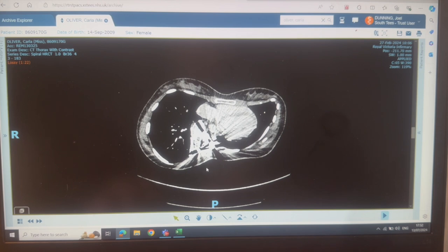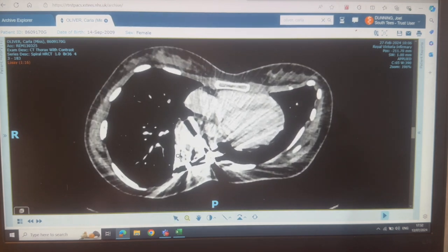This is a really weird one. This is the weirdest one I've seen recently. I thought, how am I going to measure this? Because this is very right angled and they've got scoliosis and they've got damn metalwork everywhere. What a nightmare. So I think my take home for this was keep all the lines straight. So I did the straight line here. Where is that vertebra? There it is. Get this from here to here.